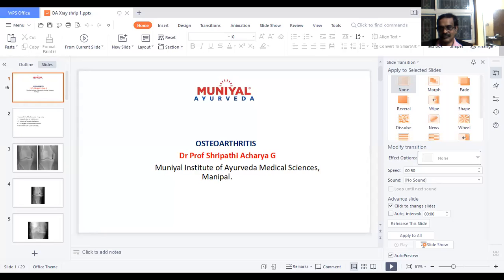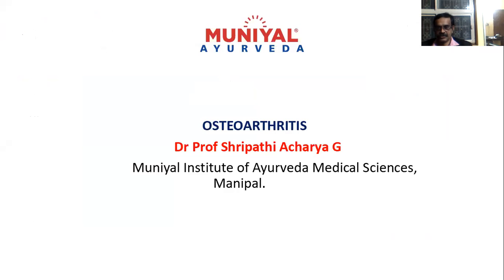Let me share. So today's topic is osteoarthritis, the X-ray study. In this video we have discussed the osteoarthritis stages in the X-ray, in osteoarthritis of the knee joint, osteoarthritis of the vertebral column, and osteoarthritis of the ankle joint.